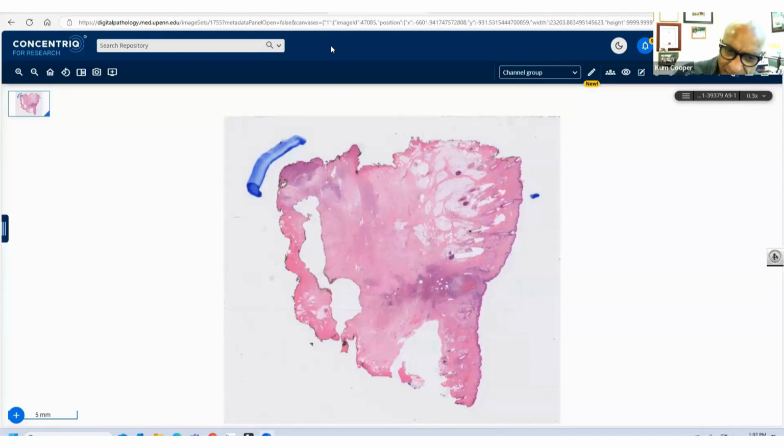This is, as we said last month, I think it was, an interactive session where I would show you scanned slides from my own collection, discuss the history with you, and then discuss the morphology, and then hope that you would contribute with the differential diagnoses and suggestions and investigations and assays or immunohistochemistry. So please feel free to join in the conversation, because that's what this conference is all about. It's interactive, and that's the purpose of linking up with Lydia and Diagnexia, so that we can have this zoomed to a wider audience.